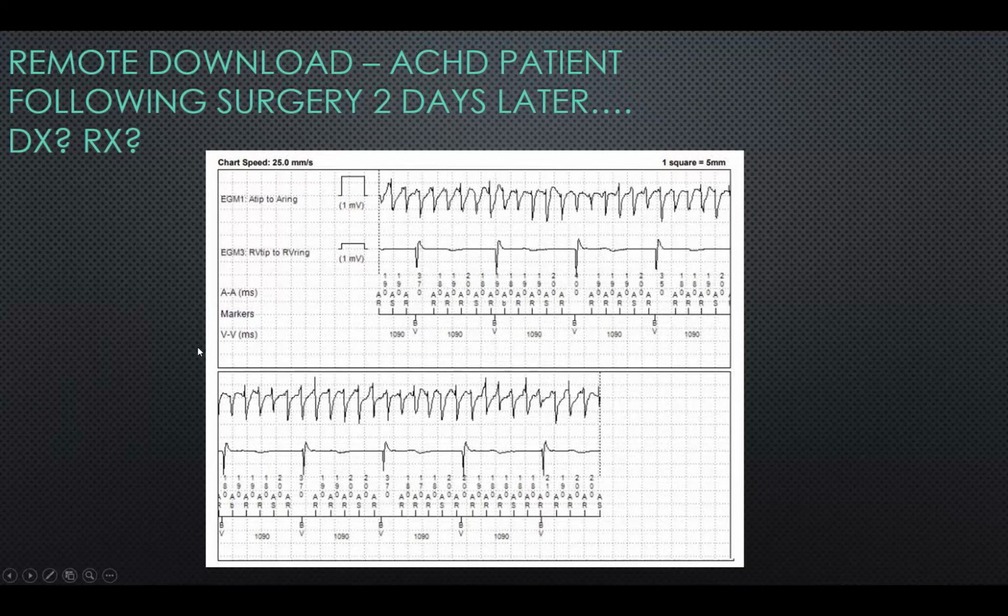Well, the marker channel is telling you what's going on, right? So it's a combination. AR stands for atrial event refractory period, and AS is atrial sensing beat. So if a beat is falling within a period that's supposed to be refractory, it will just call it AR.